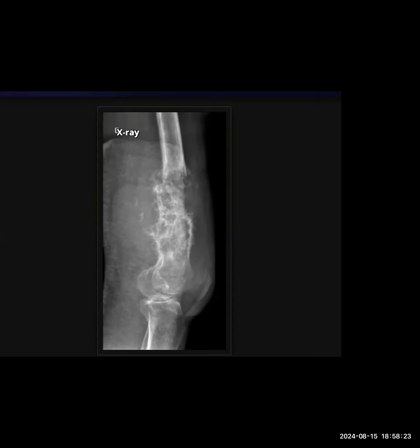No, you told me this is a skeletally mature patient, right? So would you still keep Ewing's higher up? Would you still consider Ewing's? No, Ewing's would be lower down my differential.